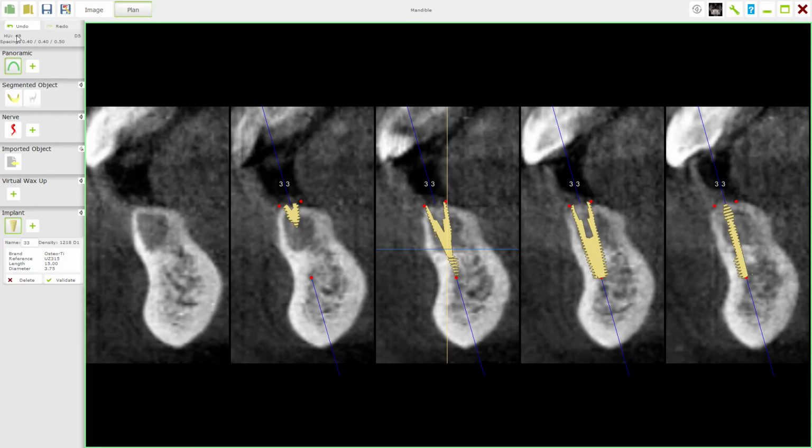So if you look in this area here, go to the top left hand side of your screen, you can see what it's saying. It's giving a D reading. If I put my cursor in the first view there and move it around for you, look at the D reading up here. There's a D reading going to appear. It's saying D5. D5 basically is fresh air, and I might position this into the tongue, and if I move my cursor now to this area and position it here, look at what it's saying.